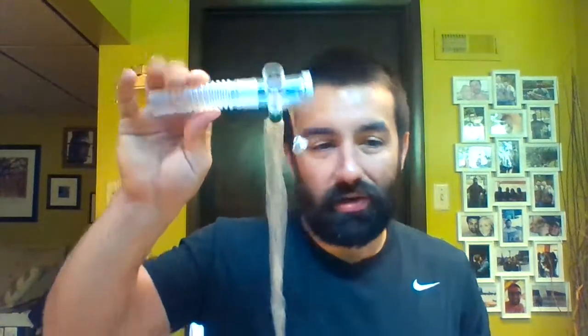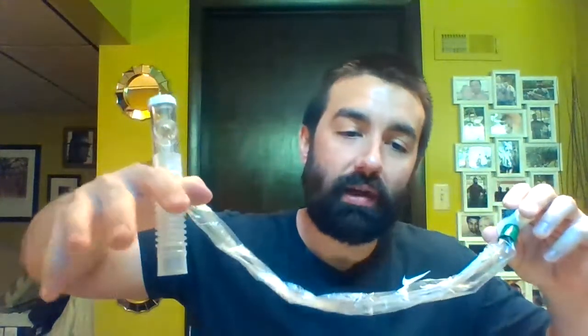So biggest benefit is, once again, it doesn't disrupt ventilation. You don't lose PEEP. And it's easier to do, really, less chance for infection, hopefully. But if you're doing true sterile technique for open suction, it shouldn't be a problem either. You guys know how to pick proper size suction catheters. You should know some of the bad things that can happen with suction, not only mucosal trauma and everything like that, but you can have acute stuff, so bradycardia, hypotension, increased ICP.